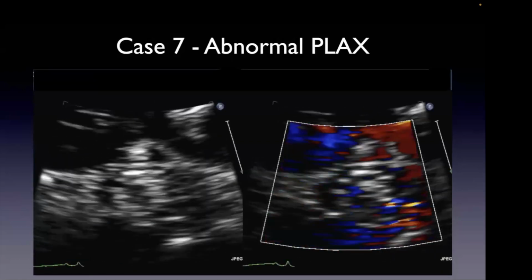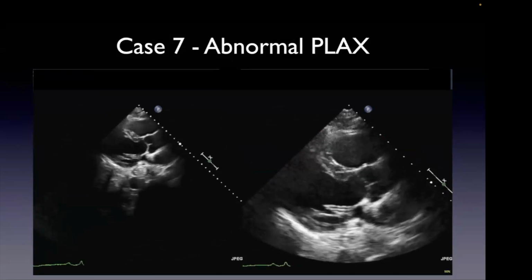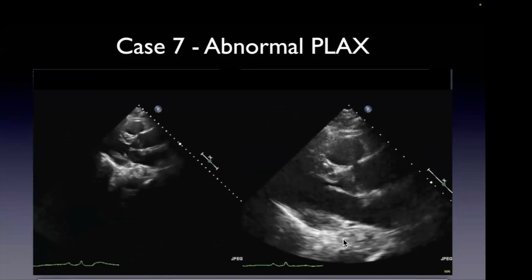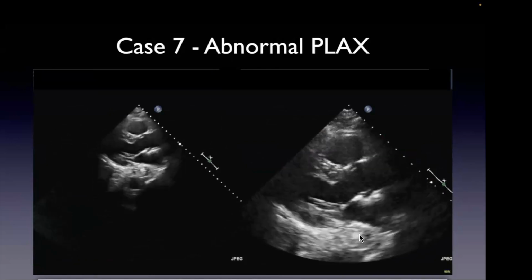Because, it's a zoom. Because you look at the rings. It looks pretty round, circular, and then there are these little dots. That's what I was trying to say. Yeah, it looks like the mesh of a stent, right? And you're right, this is a stent.